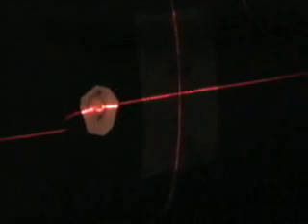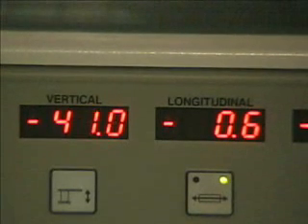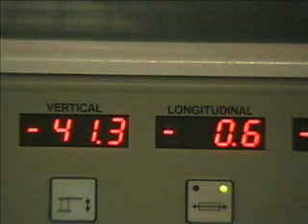On this phantom, superior being located up here and inferior being located down here, I have put a piece of masking tape where central axis currently is. This is the patient's anterior, up here. Looking at the table coordinates, I have a value of 40.3. If I move that 1 centimeter, I get a value of 41.3. Now, when we look to verify that the shift was moved 1 centimeter anteriorly, you can see that it is located up here as opposed to down here where central axis used to be.